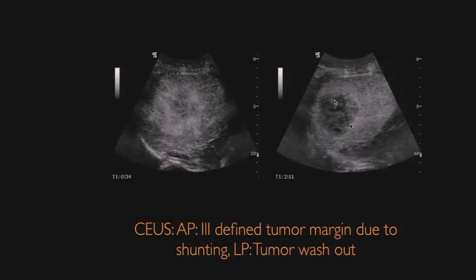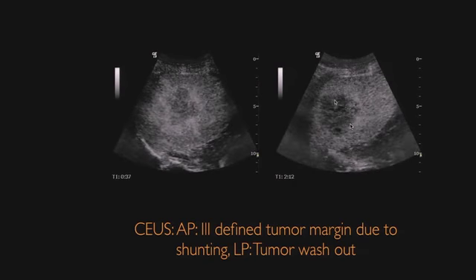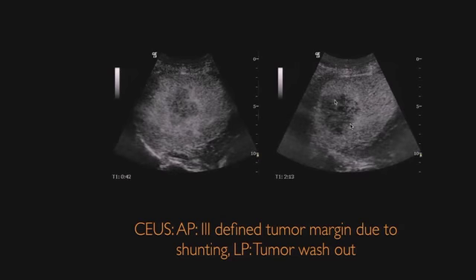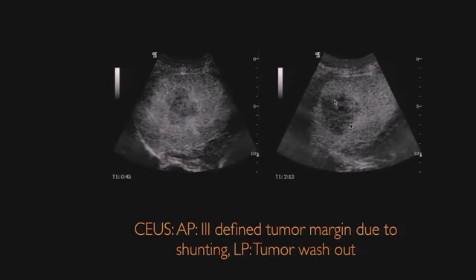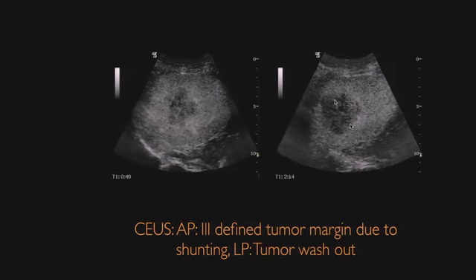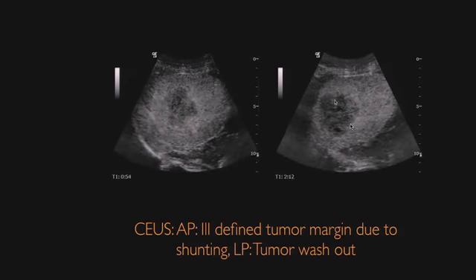So the idea was, when we saw that, how big is the tumor? You can measure it as the hyperenhancement around the tumor. Does that belong to the tumor, or is it only shunting? And we think it's only shunting. We asked our pathologist after surgery, what does this tumor look like? Many metastases, satellite metastases maybe? No, it's a very, very well-defined tumor.